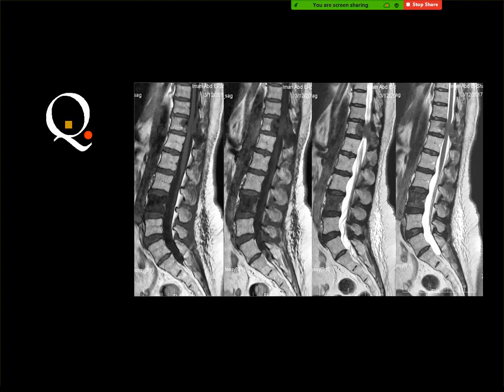Multiple secondaries. Yes, and this is a simple diagnosis, of course. And you remember, for the diagnosis of metastasis, you do not usually need to inject contrast material, because you can see the lesions very well in the T1 weighted image. And if there is an extraosseous soft tissue component, whether in the paravertebral space or inside the spinal canal, you can see it very easily.